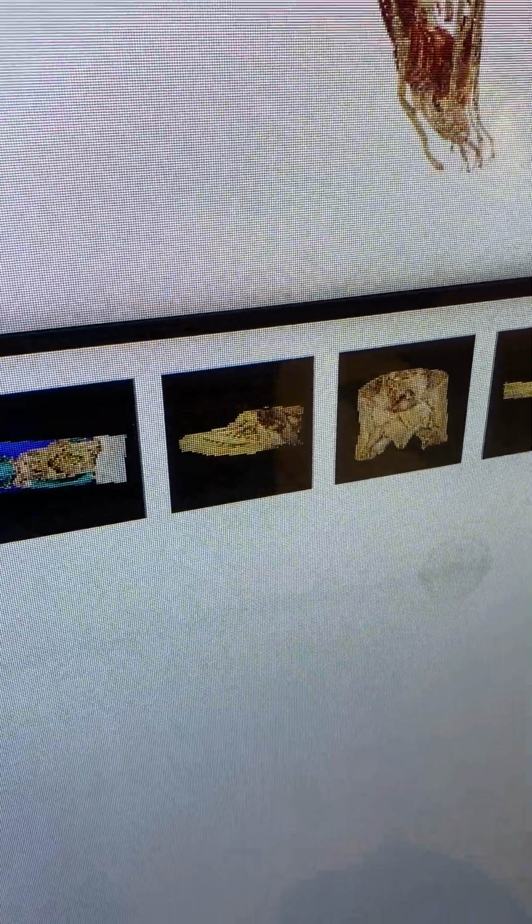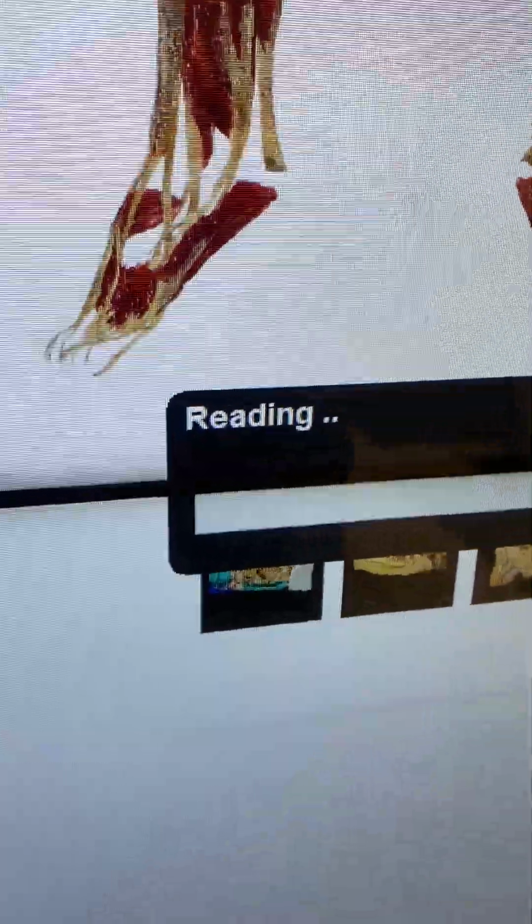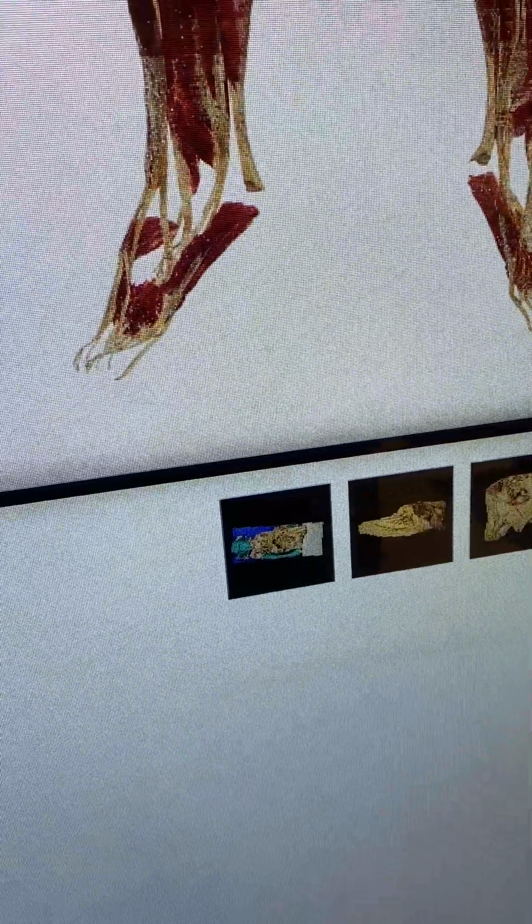Cross-sections have 3D. Let me tap on this one and show you. It's coming up. They have 3D models of the real cadaver. Those cross-sections are very cool to see, the cadaver and scanning. And you can study the part related to the segment you want.